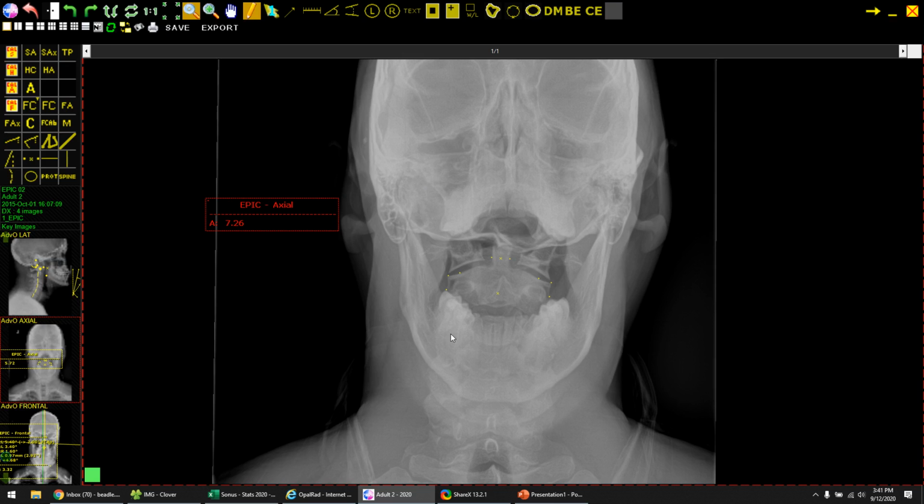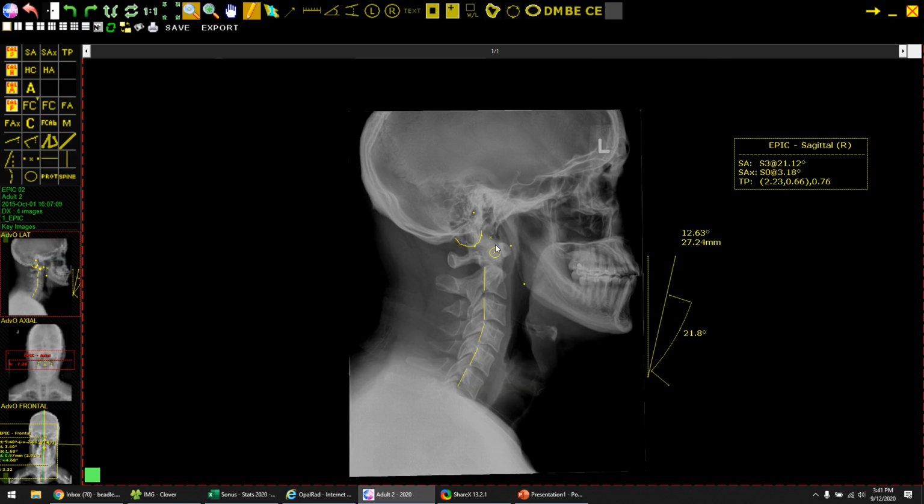That's one of the things that I'm really excited about with CBCT and what you guys have, is that we don't have to do this open mouth thing. We can just look right at that C2 real quickly. So that's going to be a bonus in your presentation. Going back to the sagittal, as another bonus in your presentation, it will actually be showing kind of like a slice where you can see the transverse process and zooming out to the skin. You'll get a lot of wow factor on that one.